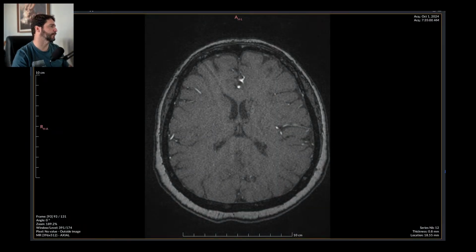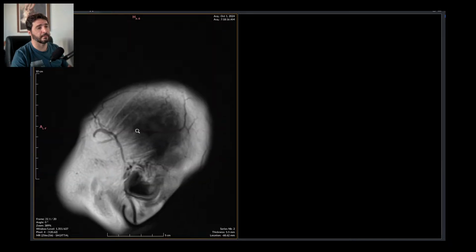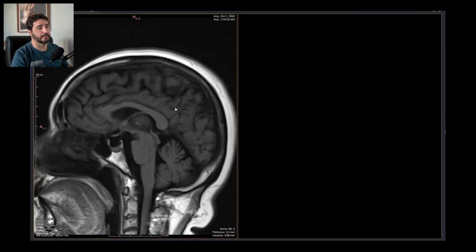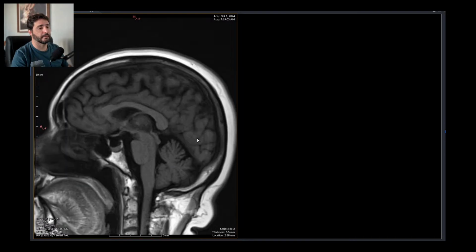Let's see this patient. Did she have any contrast enhancement? No contrast enhancement, of course. Why make our lives easier if you can make it harder? So no contrast enhancement. He is 63 years of age and complains of headaches. So MRI scan for headaches. Must be some headache, right? Oh yes, this is terrible. Lots of noise. This is a very low quality exam.